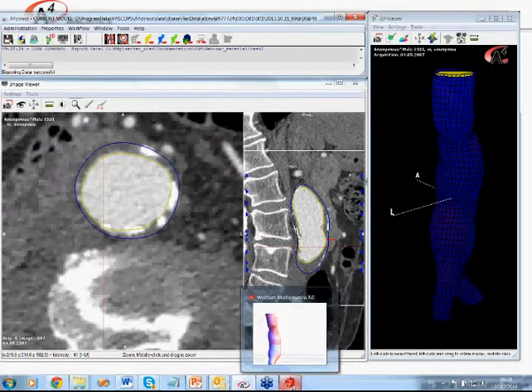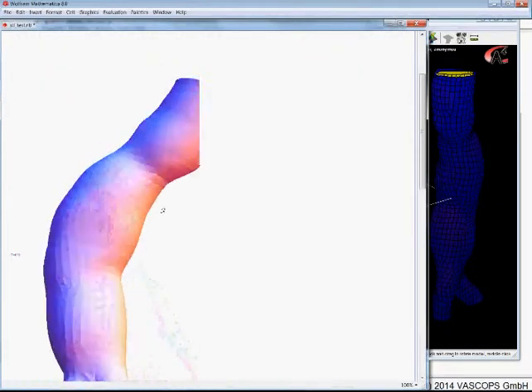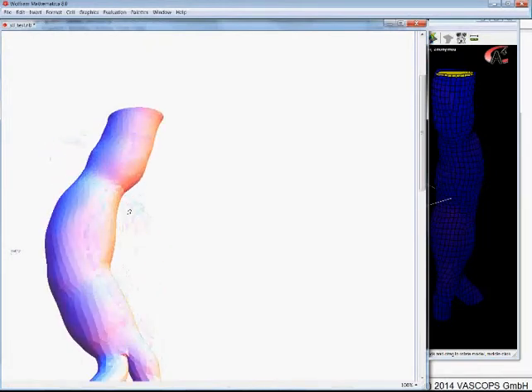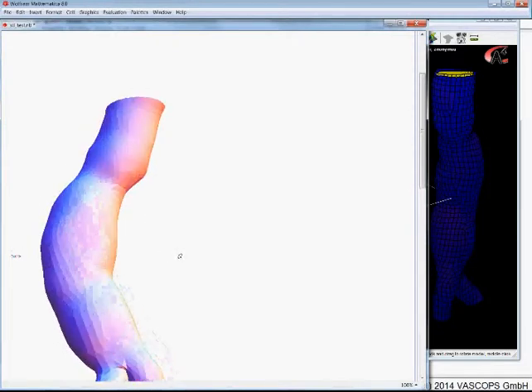I will also just show you that you can immediately import this. This is done here in Mathematica, for example, and this is how this STL file looks like without any refining or polishing. So that's the raw STL file, and of course you can then modify it accordingly.